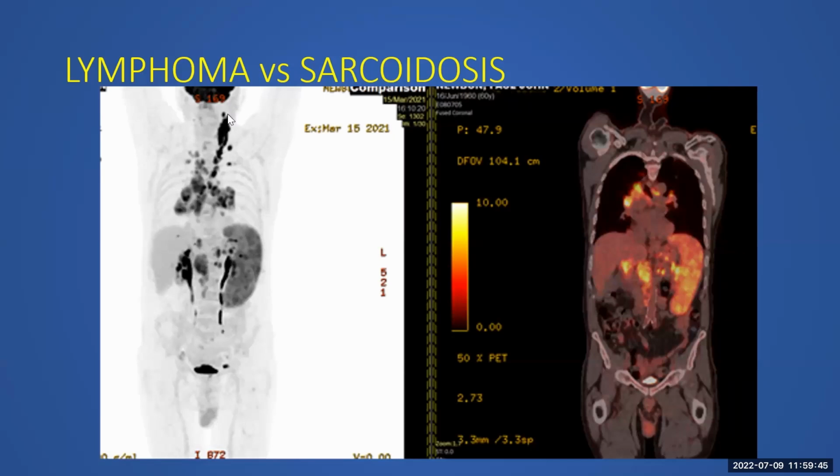They almost look like unilateral involvement in the neck and even the mediastinum, a lot of nodes involving the mediastinum and even the paracardiac regions. You can see these areas of tracer uptake, the FDG PET showing uptake in the pericardiac or lower hilar regions, and a lot of nodes in the abdomen. But finally they got a tissue biopsy and histopathology. It came out to be sarcoid.